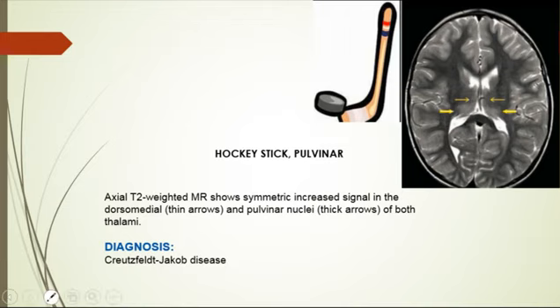Also in the caudate head, putamina, globi pallidi, insula, cingulate cortex, periaqueductal gray matter. Occasionally also intrinsic T1 shortening and T1 hyperintensity may be present, which is thought to represent deposition of prion proteins. In the late stage, there is a massive loss of the brain tissue that produces what's called the spongiform or Swiss cheese appearance. Like Swiss cheese, you know, filled with holes.